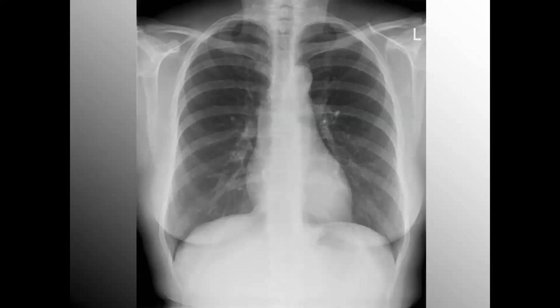You don't always see the scapular border. If you know they're in an ICU, they're non-ambulatory, 90+% of the time, it's going to be an AP chest X-ray. And I say this often, but you must be familiar and able to recognize normal in order to properly appreciate an abnormality. Reference is everything.